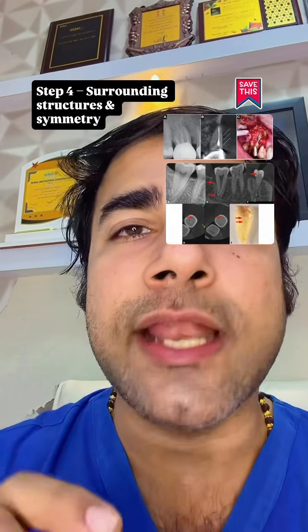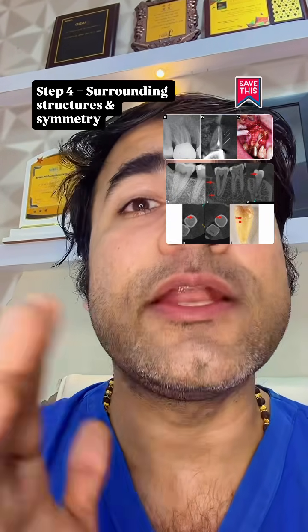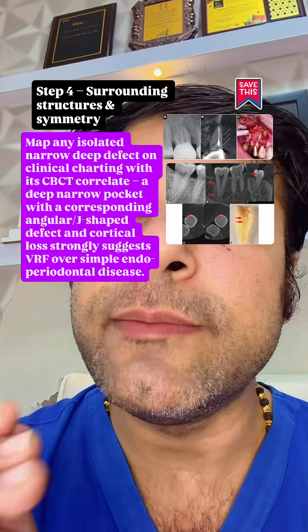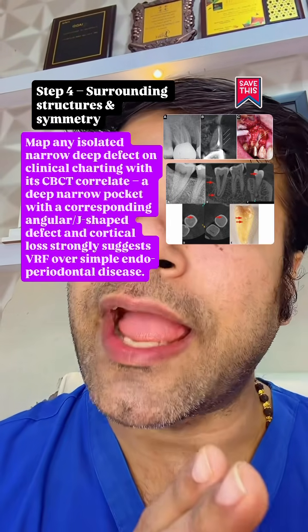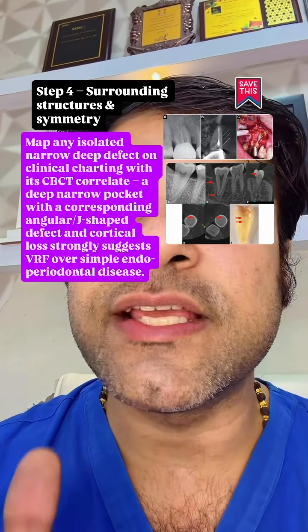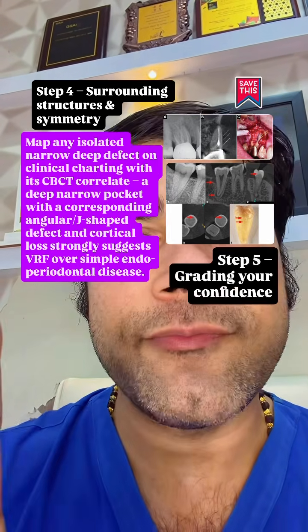Step 4. Surrounding structures and symmetry. Compare with the adjacent teeth and contralateral side when possible. Map any isolated narrow deep defect on the clinical charting with its CBCT correlate. A deep narrow pocket with a corresponding angular or J-shaped defect and cortical loss strongly suggests vertical root fracture over simple endoperio lesions.